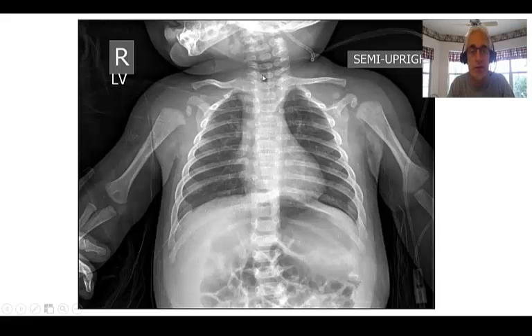Now this is a little one, presents with cough, wheezing, shortness of breath, hypoxemia. You get a lot for your money with an X-ray of a child. The airway itself looks good. It looks patent. I don't see any evidence of croup. With croup, you'd see what's called a steeple sign, a very narrow area of the trachea, way at the top of the airway. Bones look good. Cardiac shadow looks normal. Diaphragms are somewhat flattened.